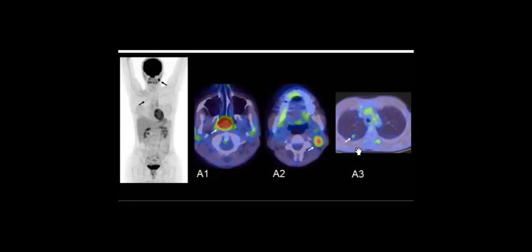And after treatment, she started to have some restaging. Yeah, restaging. Smart answer. But then they will ask you to localize which type of pharyngeal. Is it nasopharyngeal or oropharyngeal or laryngeal? So yes, it is nasopharyngeal. Perfect. So nasopharyngeal, and you can see it much more easily here. Again, sometimes you can see the Waldeyer's.